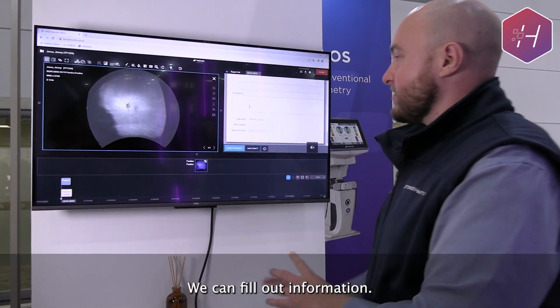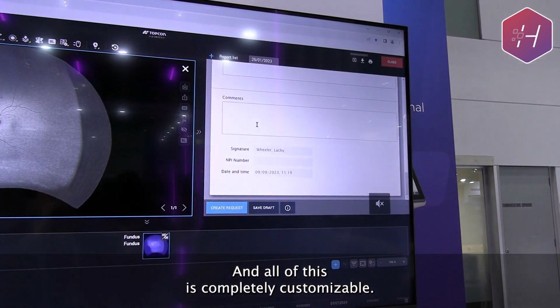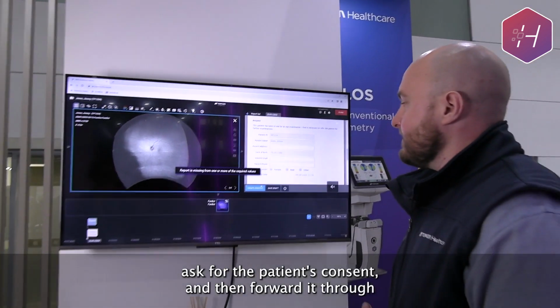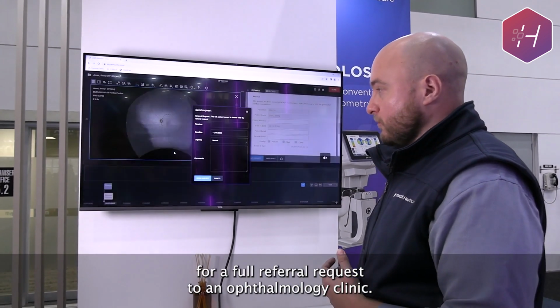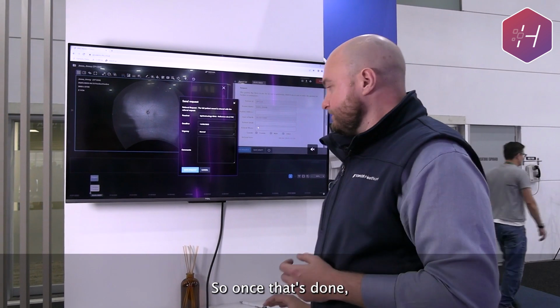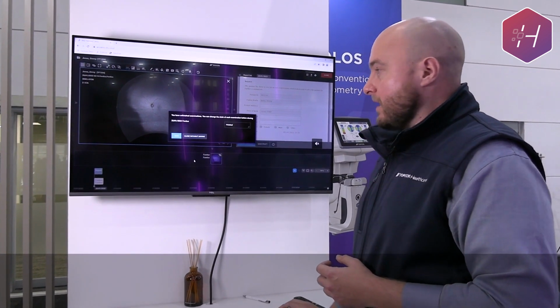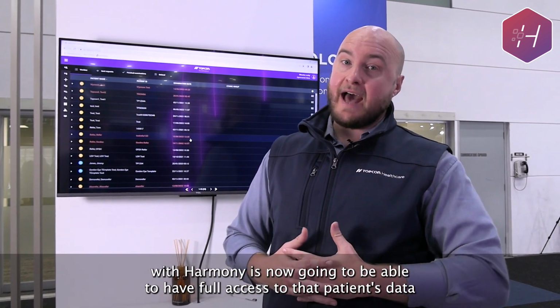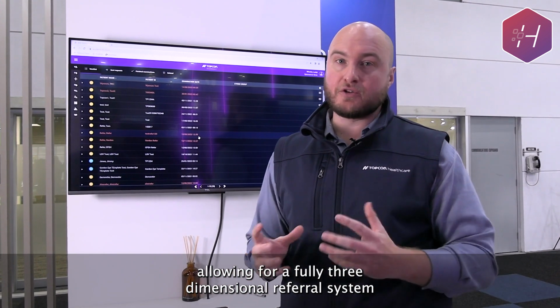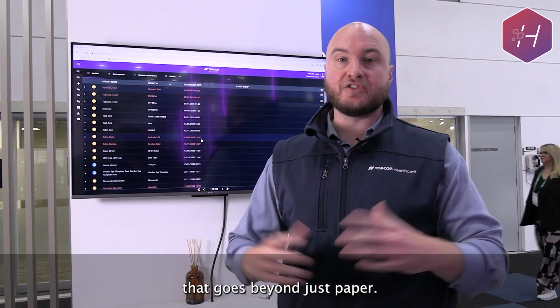We can fill out information, and all of this is completely customizable. And once we finish filling this out, we can create that request, ask for the patient's consent, and then forward it through for a full referral request to an ophthalmology clinic. So once that's done, the ophthalmologist with Harmony is now going to be able to have full access to that patient's data, allowing for a fully three-dimensional referral system that goes beyond just paper.